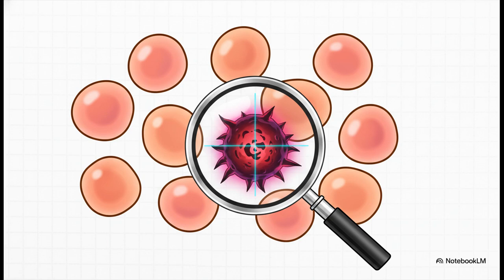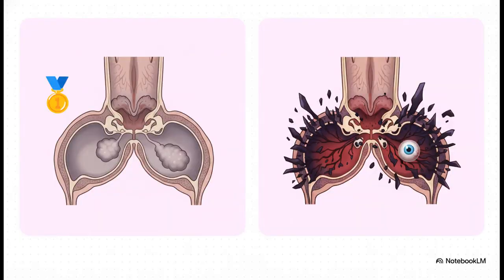So whenever you think you see an inverted papilloma, your job is not done. You have to meticulously search that scan for any little area that looks more aggressive or suspicious. Speaking of which, let's look at the two big bads of sinonasal cancer. Squamous cell carcinoma, or SCC, is the most common by far. It loves the maxillary sinus, and on imaging, it can sometimes enhance a little less than other tumors.